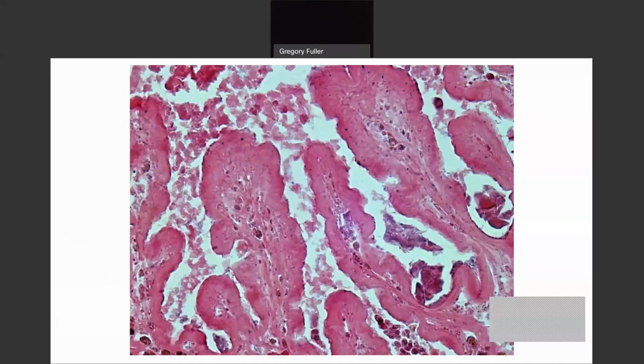Keep the lessons in mind. This is what you're going to get along with a lot of inflammation and stuff, right? But that wavy fold, with the lamina, the layers, and the tiny little nuclei, even if they're going out, it is enough to make the diagnosis if you've seen it before. All right, let's get back to our patient.